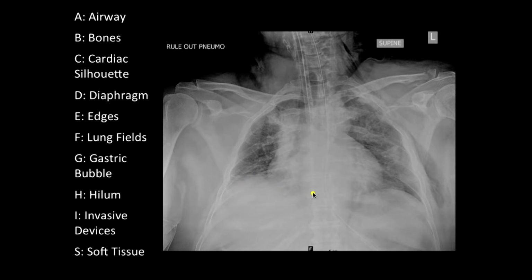We're going to look around the margins of the film just to check that the patient doesn't have either a pneumothorax or a pleural effusion. When we look here, we certainly have got some soft tissue thickening, but that may be contusion from the adjacent rib fractures. We'll follow the margin round. We're not seeing a particularly deep costophrenic sulcus here, but I would be suspicious in a patient with rib fractures to make sure they don't have a pneumothorax.